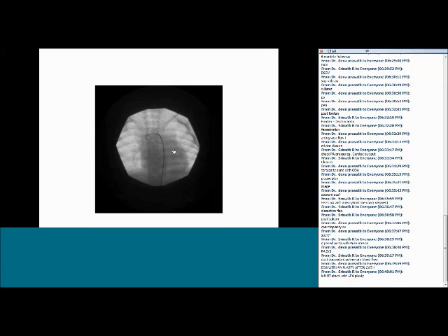Both are actually correct. This is a matter of debate because the left pulmonary artery is not so great. So even if you do a PA plasty in this patient, probably the Glenn might not take it because of the diminutive size of the LPA. So you might sometimes get away with just the BT shunt and later on, quickly in the next 3-4 months, do a Glenn.